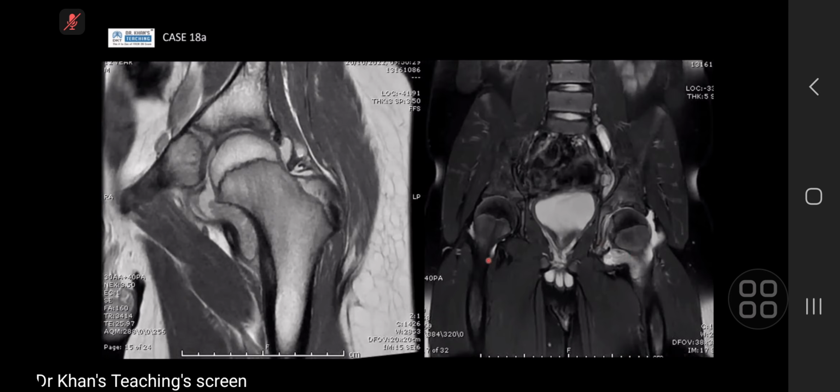There's a large joint effusion on the left, not on the right, as in there's always going to be a little bit of joint fluid that's within normal limits. What's interesting is the presence of this synovial proliferation, almost looking quite like rice bodies. It's just the appearance of it. Of course, we often think of it in something chronic, like chronic TB, RA.